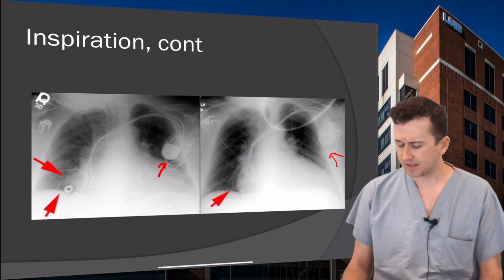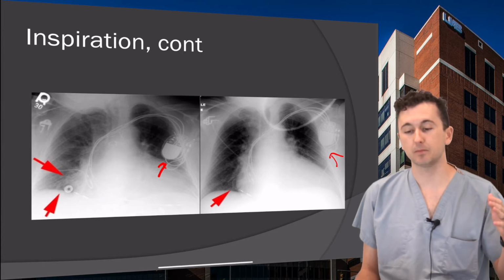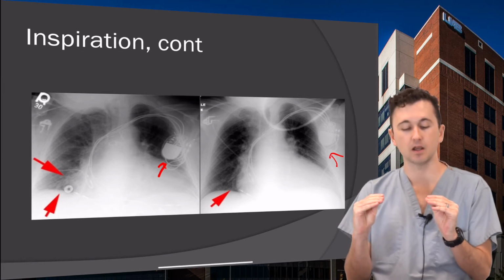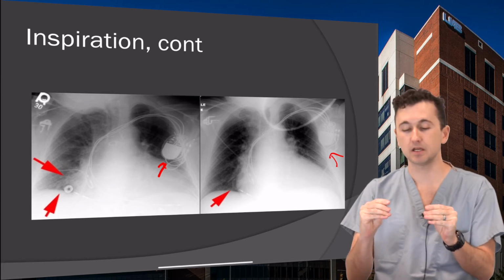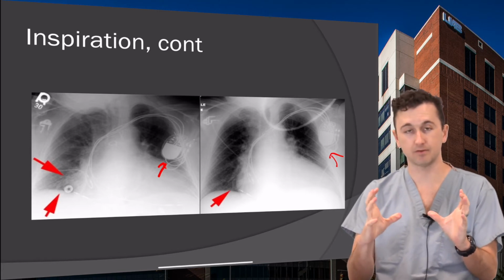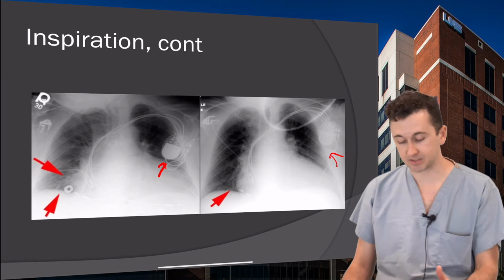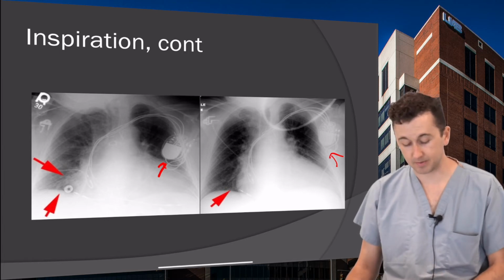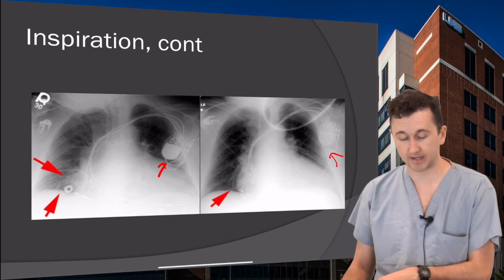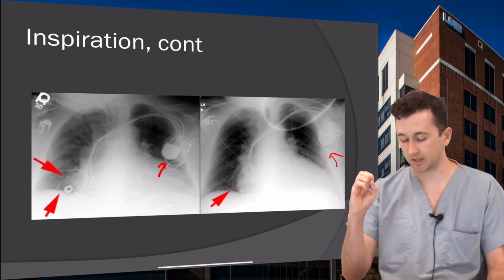The other thing that this does is, if we go back to penetration, if you capture a film at the end of exhalation, so you got your alveoli in your lungs that are slowly exhaling, getting rid of all that air, and then the alveoli collapse, and so now you have dense alveolar lung tissue, which is going to be more white than alveoli filled up with air. And so that's the reason, if you look at the image on the left, that this is the same patient taken 2 seconds apart, that the patient's right lung on our left side is much more white compared to the x-ray on the right. And nothing's changed pathologically or clinically. That's just the difference between alveoli that are open and alveoli that are collapsed.